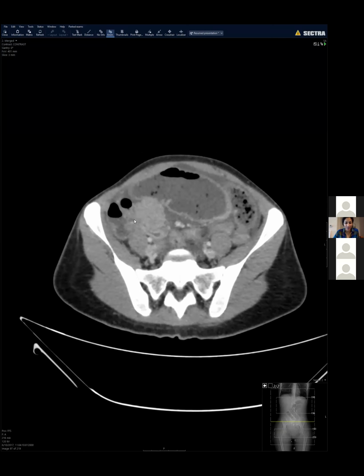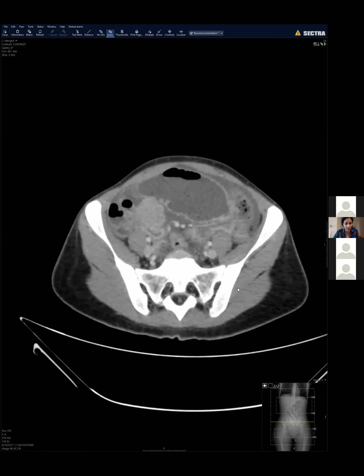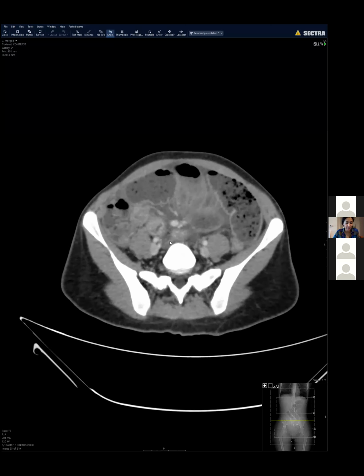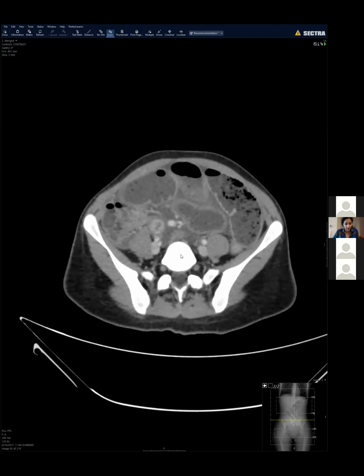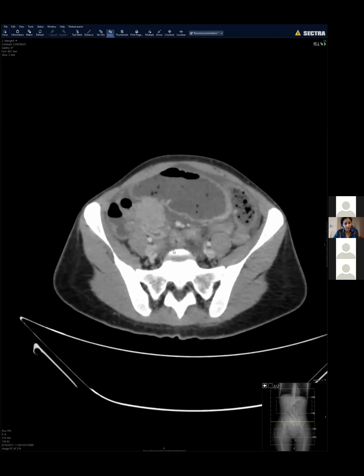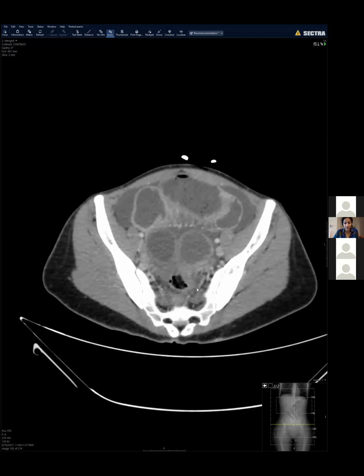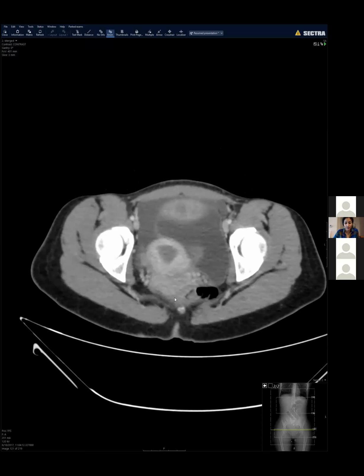So looking at this area here, it looks like there's almost like a mass, maybe, affiliated with the small bowel in the right lower quadrant. Right. So this was appendix. So this was around the IC valve area, which makes sense that there is something obstructing at the IC valve. Let me run the colon for you just to complete our bowel.